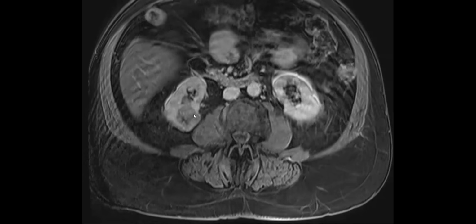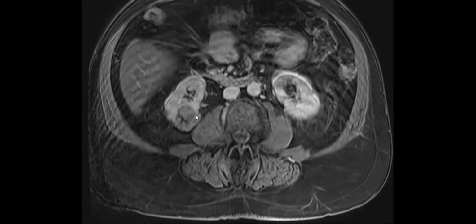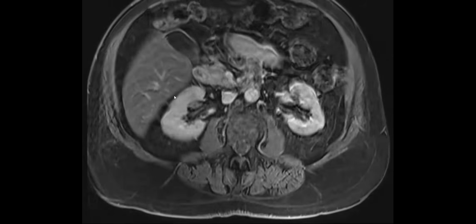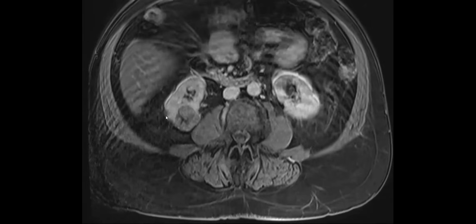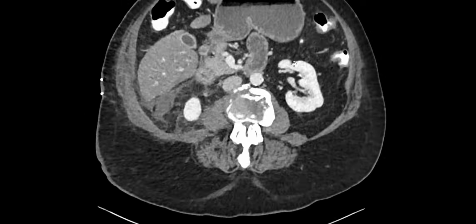But the point of this case is to discuss the RENAL nephrometry score. The score is basically saying how easy it's going to be to do a partial nephrectomy versus a total. If it's more exophytic, a smaller lesion hanging off one of the poles, then that's much easier to do a partial nephrectomy on, and laparoscopic. If it's in the interpolar kidney and getting very close to the collecting system, this makes it more challenging to do a partial nephrectomy. And then the size: the larger it is, the harder it is to do a partial nephrectomy. So anyway, they came post nephrectomy.